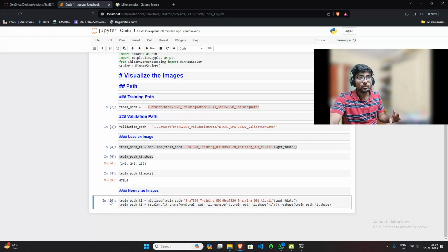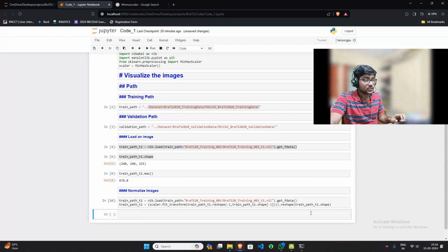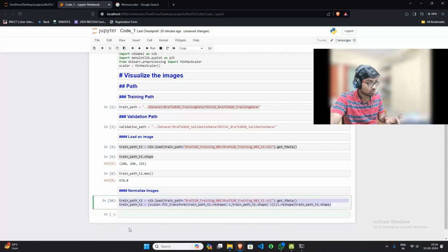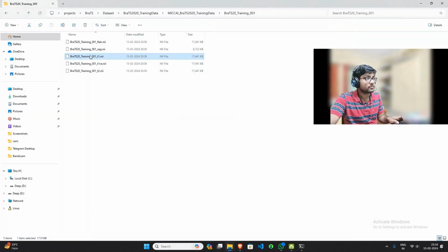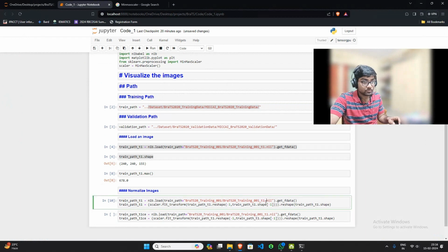Next we will do T1 CE, T2 and FLAIR. We'll do this fast. I will copy the whole thing and put it here. Then put CE here, then put CE here. What was the image name? It is T1 CE. That's nice. So we're going to put CE here, here, here, and here. And I think we are good.